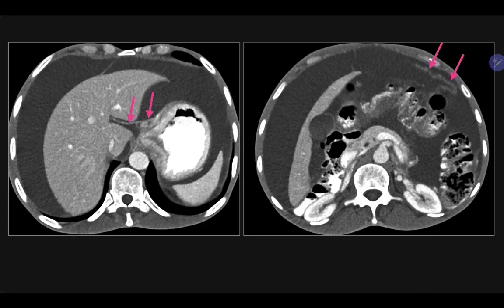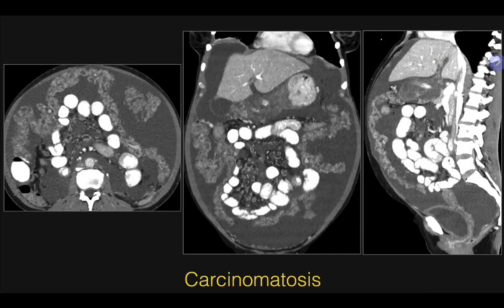This is peritoneal carcinomatosis. And when you're dealing with gastric cancer, you must become comfortable with catching carcinomatosis in its various presentations. It isn't always as obvious as this, but this advanced presentation of carcinomatosis would certainly be a giveaway and highlights the key features to look for. Here we have ascites, extensive omental caking, and nodular infiltration of the mesentery.